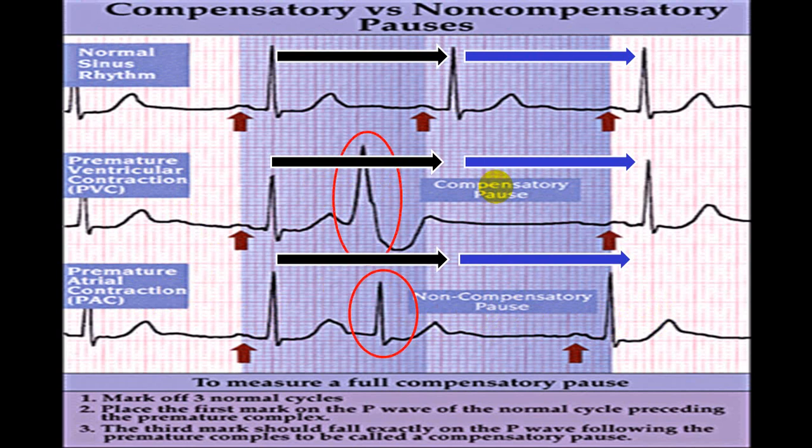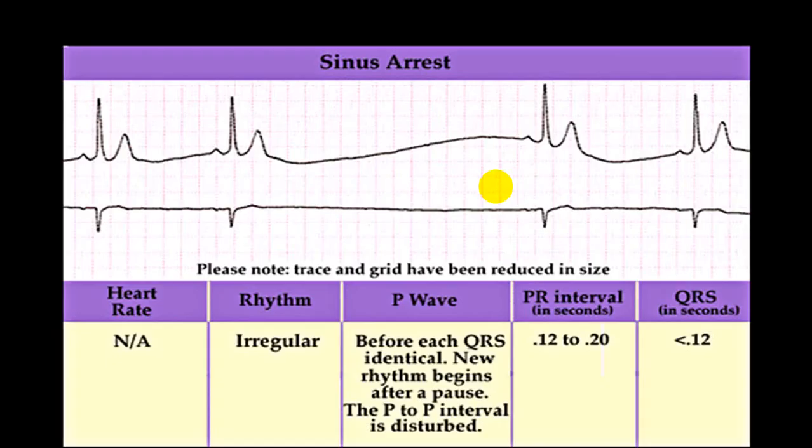So this is an atrial premature beat. This is a ventricular premature beat. Now you can see here, this is an RR interval. See this RR interval. This is very big. Again, this is an RR interval. This RR interval and this RR interval, they are the same.